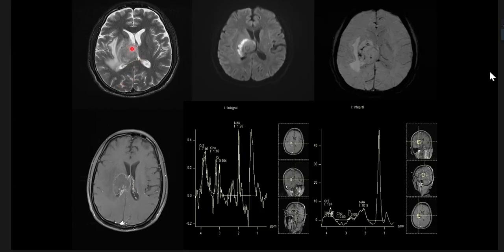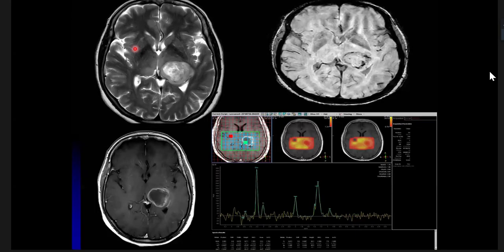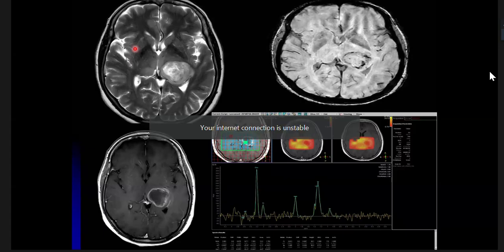Okay, no problem. So let us first find out about this case. More of malignancy, likely glioma. Or can it be a met? So it can be metastasis also, sir. So how are we going to differentiate? So basically, now let us come to this case and we'll go back to this.